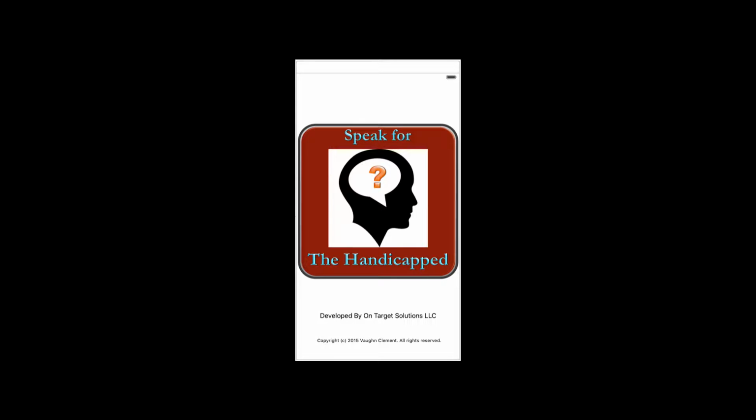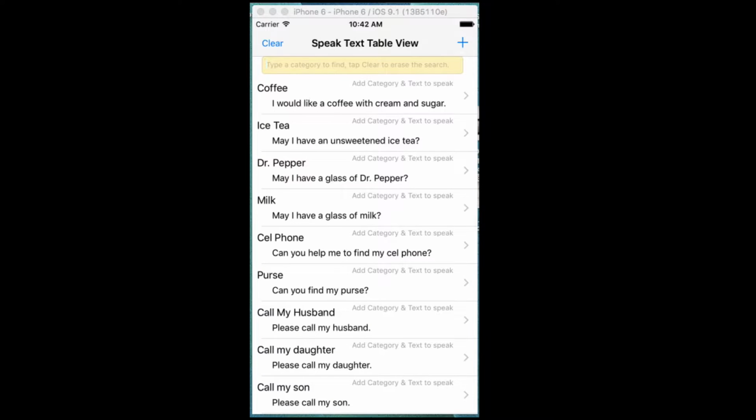Hello, this is the Speak for the Handicapped application for the iPhone. In this tutorial, you will be given the how-to-use, screen-by-screen information for using this application. So let's get started.